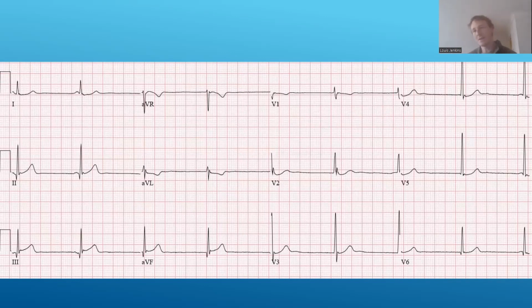Cool, so welcome back. Hopefully you paused it, otherwise it's just me awkwardly pausing and monologuing. But yeah, let's interpret. So forests and trees. Looking at the forest of this one, it's a little strange. There's a few things going on that aren't super typical of a normal ECG, I would say. Definitely have my guard up a little bit going into this one.